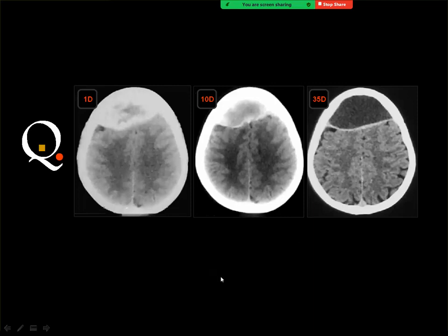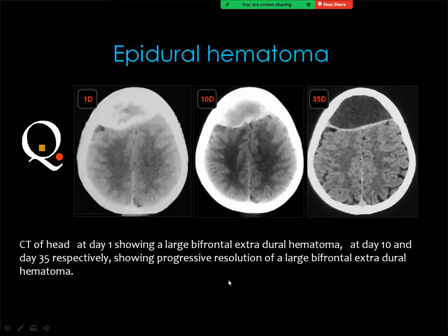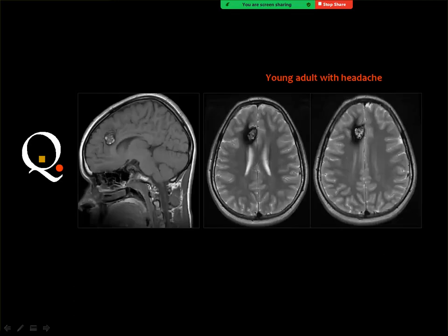This is not usually the case for epidural hematomas to pass the way from acute to chronic, because an epidural hematoma is present in a tight space, and it produces significant symptoms. Then it is evacuated before passing into the chronic phase.